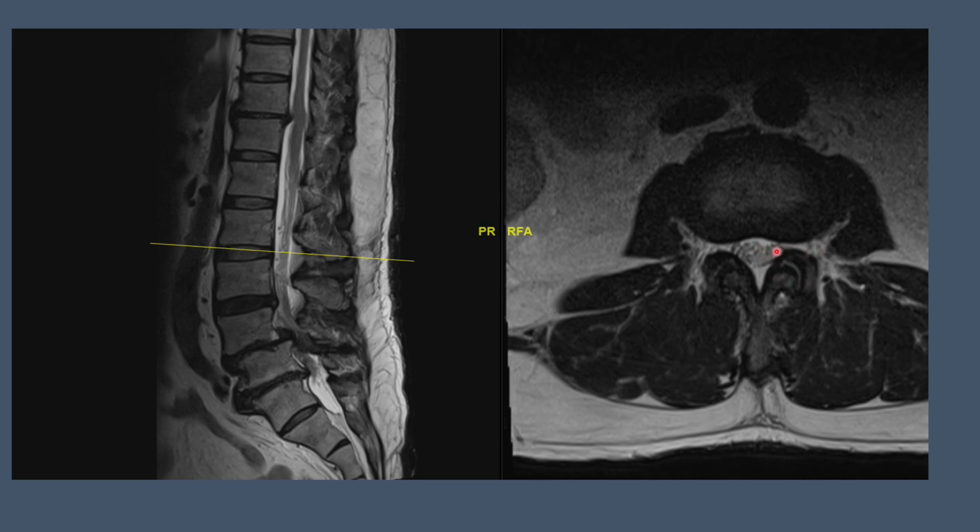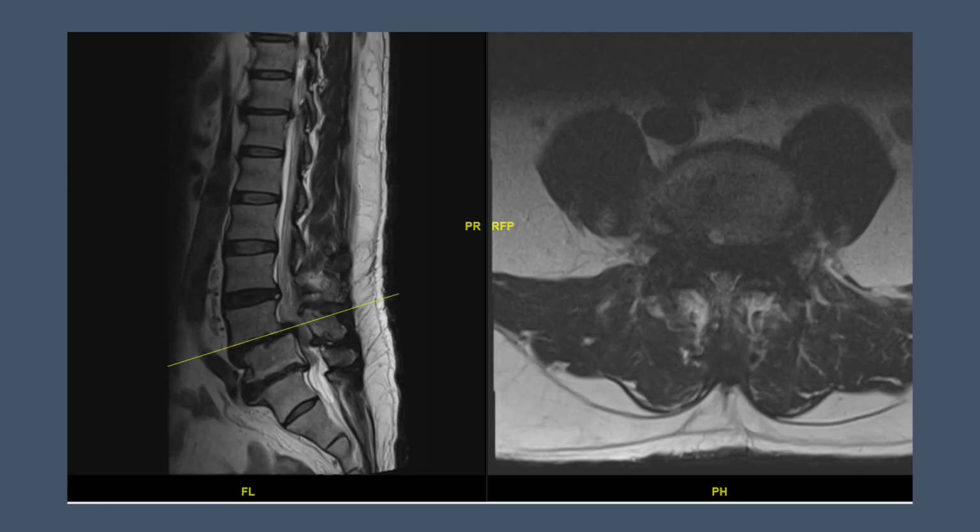And this structure here, like the hamburger here on top, would be the SAP, or the superior articular process. And then the inferior articular process here. Then you have the lamina here, the spinous process here, as well as the paraspinal muscles here. You can even make out the psoas muscle on the side of the disc, and then the vertebral body. So at this level, there is not much canal compromise, either in the central, lateral, or even the foraminal area.